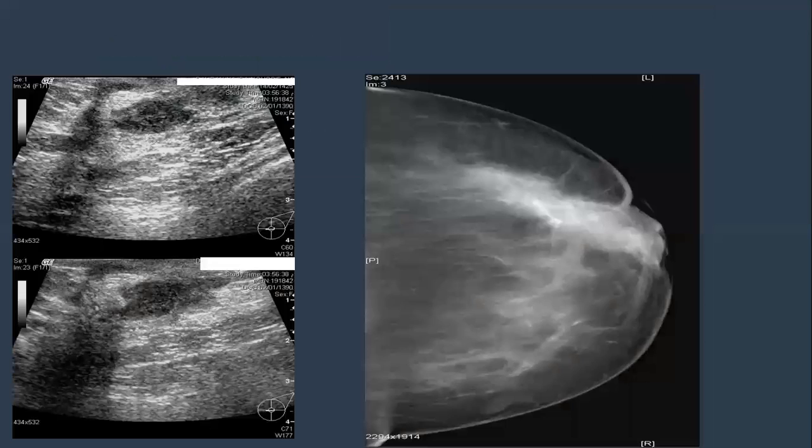And what about this, Medina? This is also a tubular linear asymmetry extending from the medial side of the left breast to the nipple with nipple retraction and involvement of the nipple. Surrounding skin thickening also. In the ultrasound, there is a linear soft tissue mass.